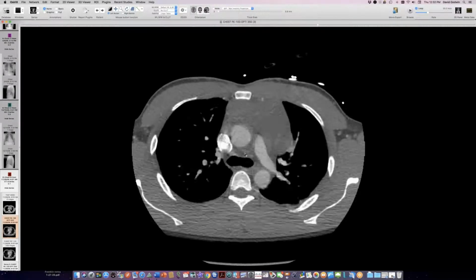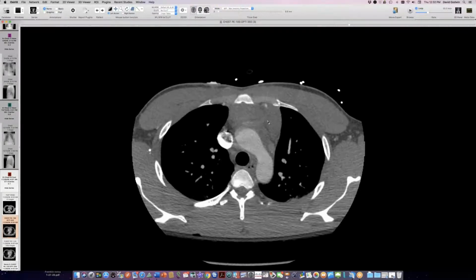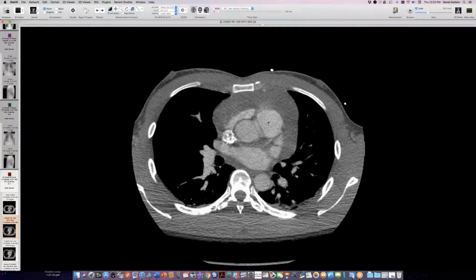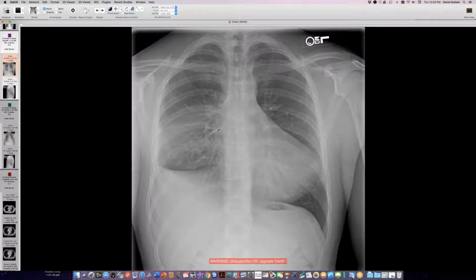It's this big fluid-filled thing with some inhomogeneity in it, but mostly just looks like liquid. So this was resected. This was called a multiloculated thymic cyst. And then after the surgery, this is a few weeks after recovery. At this point now, he's got sternotomy wires. Does have a pleural issue over here, some anterior stuff here, but the mediastinal mass component has decreased. Heart doesn't look as big as before because some of that was really the mediastinal tissue.